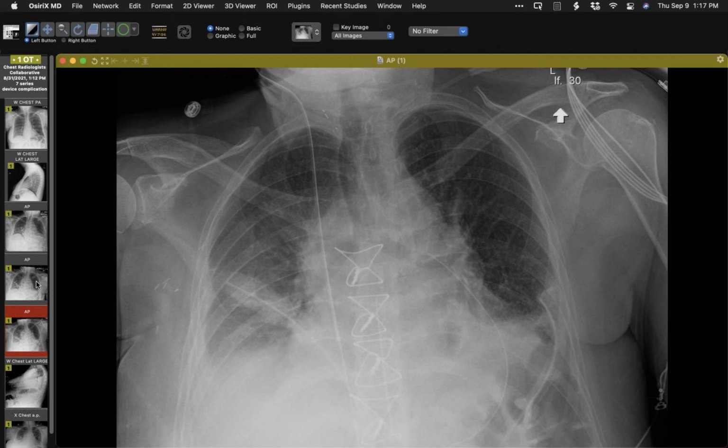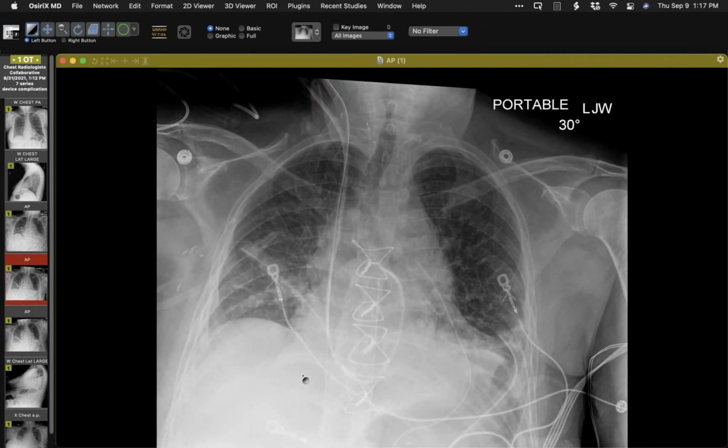So I think sometimes it's difficult to perceive when one doesn't really see something unusual, or it just doesn't fit an imaging pattern for a misplaced catheter in the usual sense, at least, because it's rather opaque and it goes to a funny place. So kind of a bit of a perceptual challenge. So that was unexpected and rather odd.